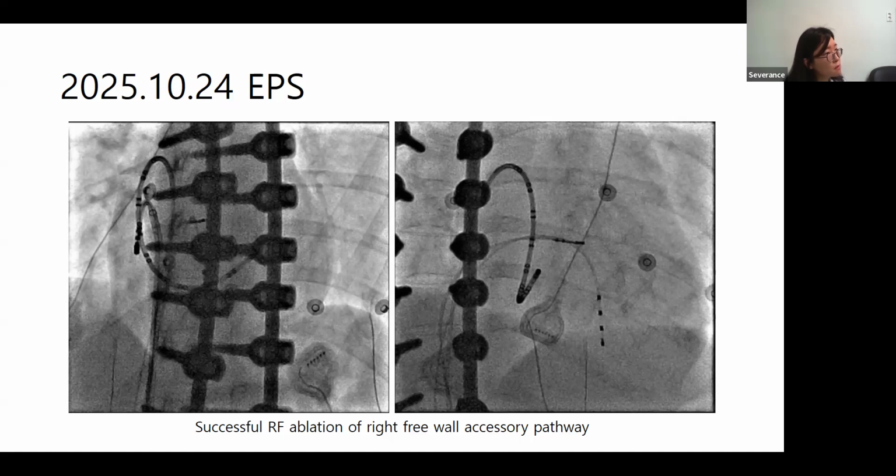So this patient shows a wide QRS, with augmented delta during APC. Sometimes it's very difficult to localize the accessory pathway position if the patient's standard 12-lead ECG shows a minimal delta. When we augment it by APC, sometimes the accessory pathway location is different compared to what you imagined.